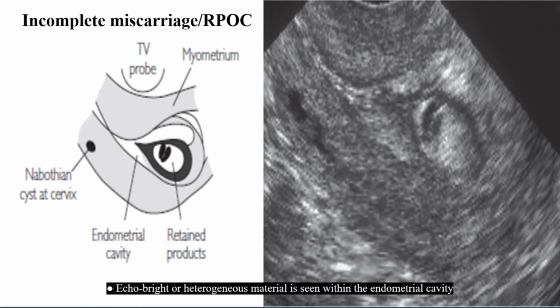Relate the findings to any prior scans. If the patient has previously been shown to have had an intrauterine gestational sac or embryo, then the diagnosis can be made confidently. Otherwise, if the beta HCG level is falling, then the report should indicate that RPOCs is the most likely cause. But if the beta HCG level is unknown, then an ectopic pregnancy with an associated decidual reaction is possible.